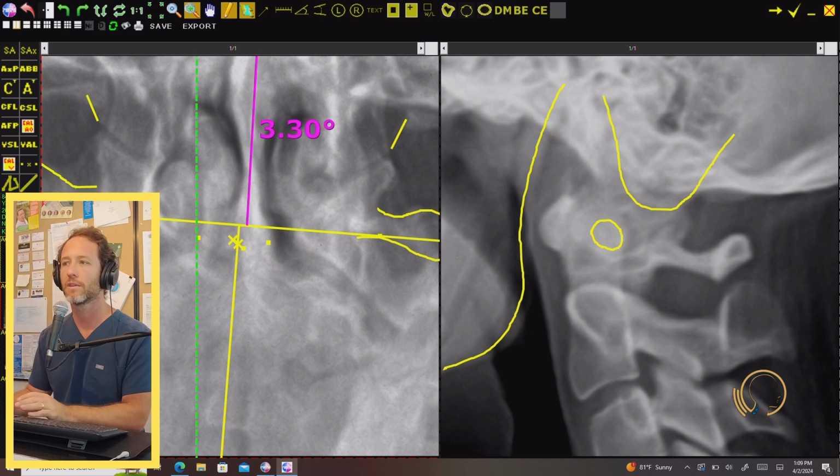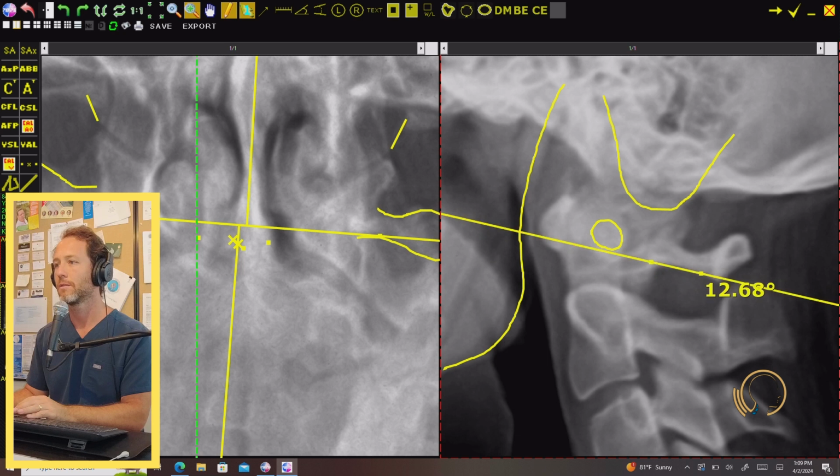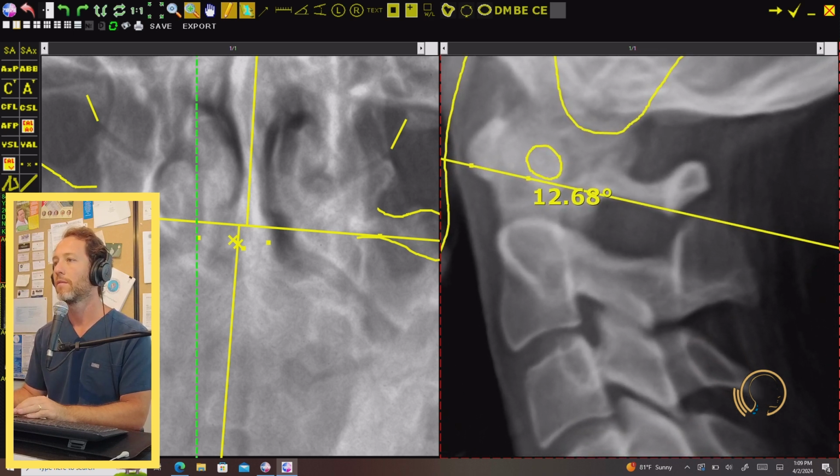Well, you have your sagittal film to cross-reference when you're trying to figure out the height, in terms of how far the spinous process is from that atlas sagittal plane line, i.e. the AFP from the frontal view.